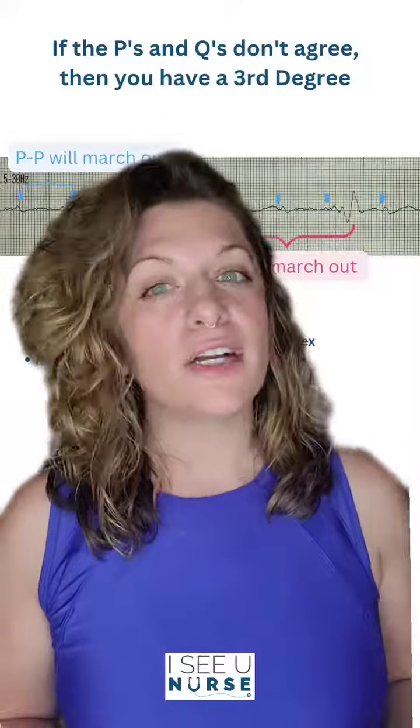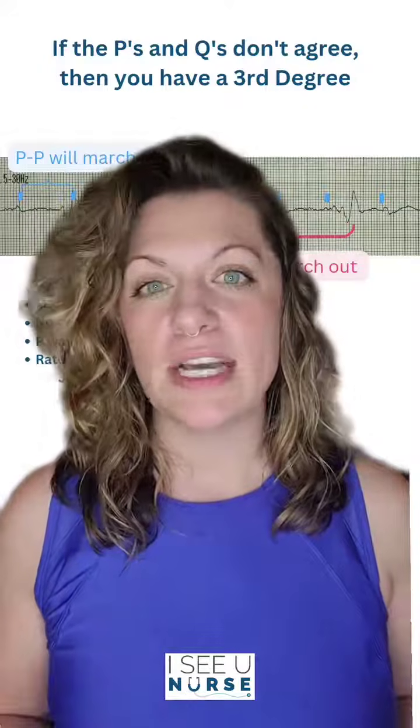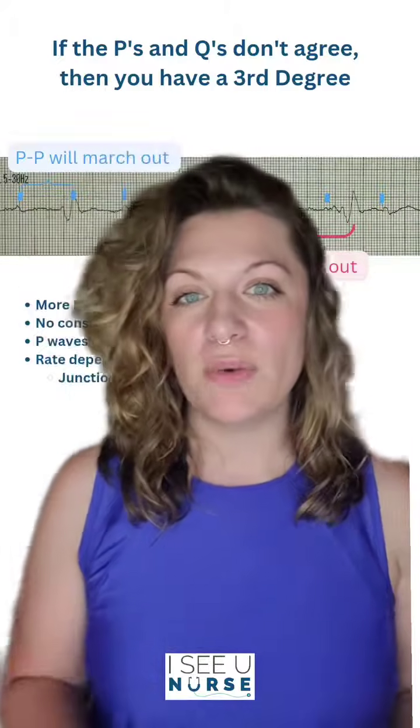I always found the block song to be very helpful when it came to understanding how all the AV blocks actually work. And per the block song, it says if the P's and Q's don't agree, then you have a third degree. So that's exactly what this looks like.